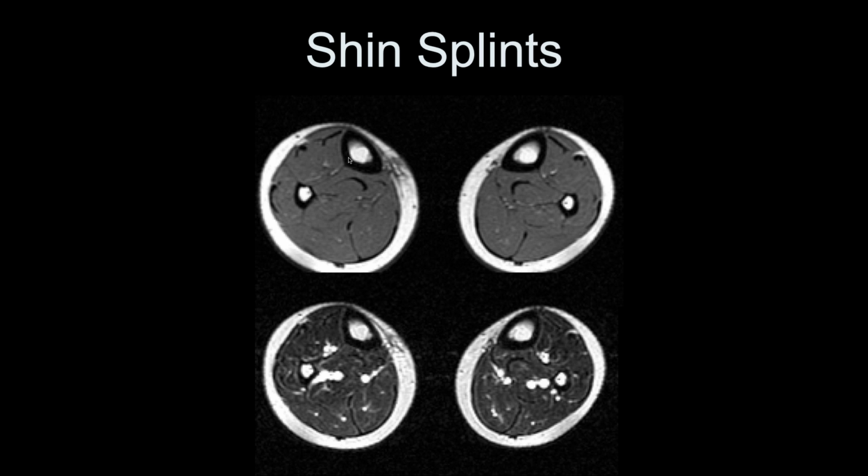Remember, in the diaphysis of the bone here, almost all the weight is in the cortical bone rather than the trabecular bone. So when you get injuries, it's really more of a cortical bone injury. Difficult cases to treat.